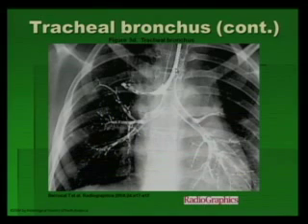Here is a bronchogram. They used to do bronchograms. That's why when we do swallowing studies to look for aspiration, we use a thin barium, because they used to do bronchograms. And here you have a tracheal bronchus right here. And I'll stop at that since it's almost 1.